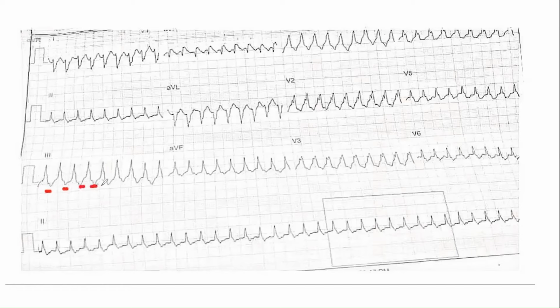You see? So now you have seen antidromic AVRT. Please remember antidromic AVRT, because it will be mostly with the left free wall pathway, unlikely a right free wall pathway, but you should know the antidromic. Antidromic will be more often atypical because it's going through the pathway and not through the node. But with aberrancy, it will be going through the node. I hope you understand my point.